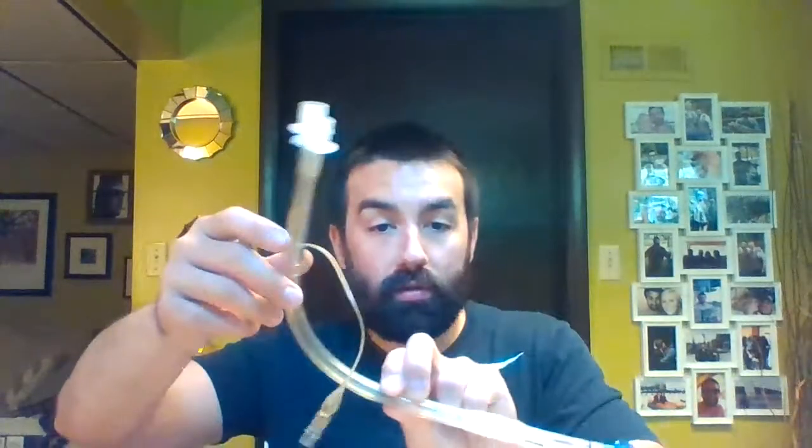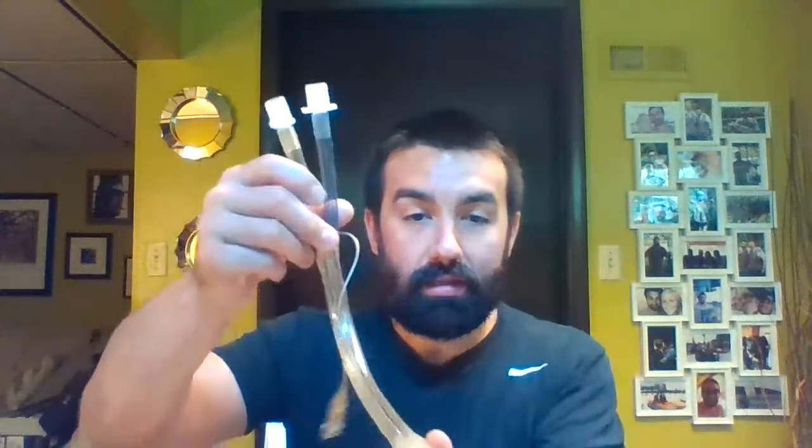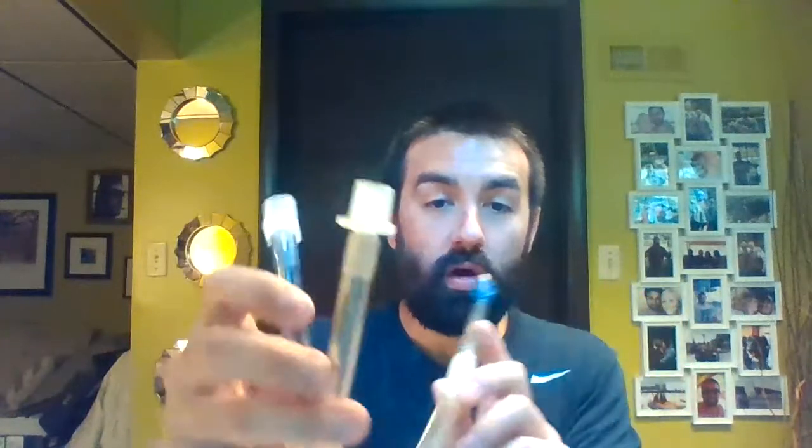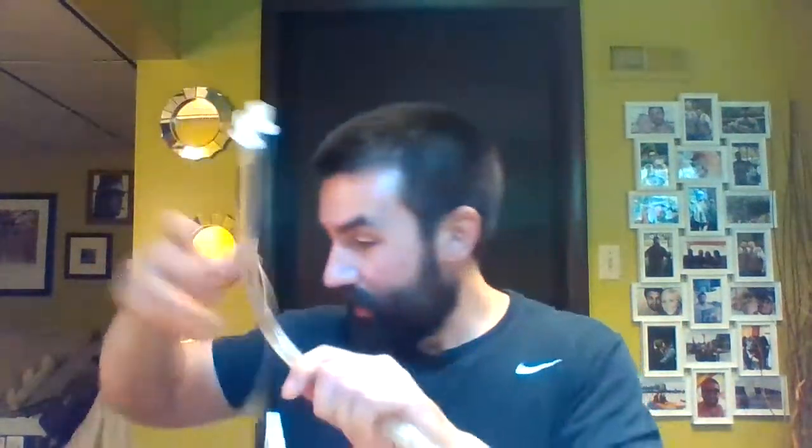So then we have a dual lumen or endobronchial tube. When you look at this, and we'll talk more about this in the strategy in our advanced vent class, you essentially have 2 tubes fused into one. You have 2 15-millimeter adapters, and 2 balloons here. Where's my syringe? I'll inflate this thing.